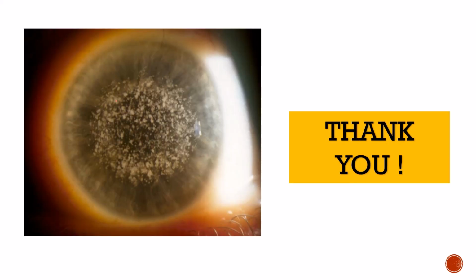Again, in this picture you can see the sclerotic scatter is actually highlighting all the structures, and the scleral ring, the ring which was supposed to come in a sclerotic scatter, is quite dim in this type of picture, because there are so many opacities present on the cornea which are causing scattering of that light which we have put on the temporal limbus. So this is actually a picture of granular dystrophy.